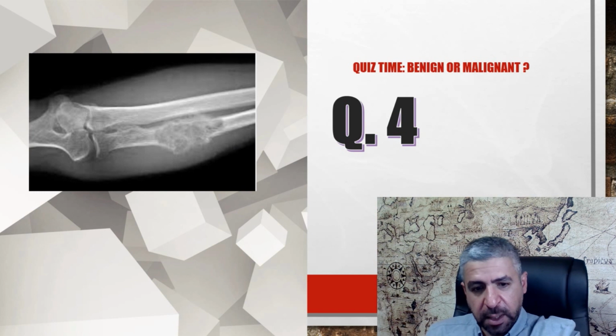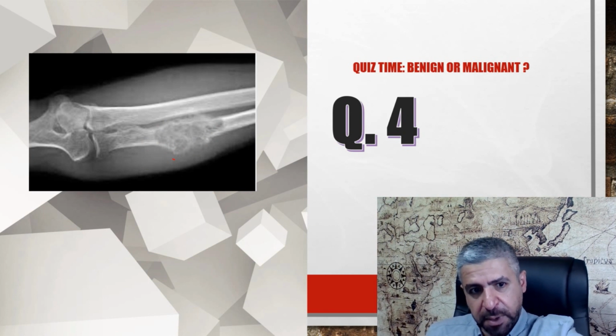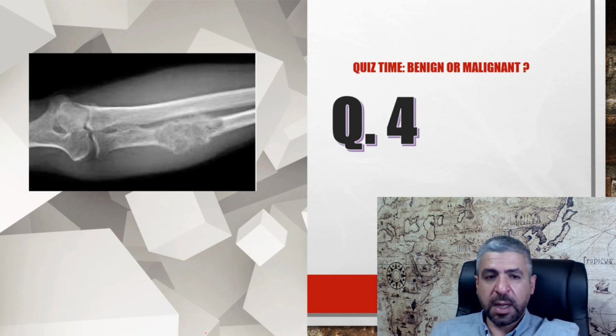Now, what about here? Again, you can see it has signs of bone destruction, a periosteal reaction that is basically a combination of Codman triangle and a sunburst appearance. It has a relatively ill-defined zone of transition. It has some soft tissue extension and soft tissue component, confirming this is a malignant bone lesion, and in fact this was an osteosarcoma.